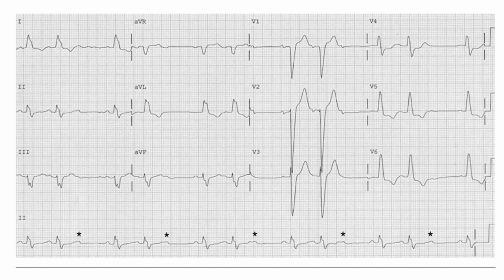If you see here, look at the rhythm strip. This is a P wave here, and this is a P wave here, but there is non-conduction of the impulse. And you can see the PR interval. This is the PR interval. They are all the same. So this is a case of Mobitz type 2 block, and you can always appreciate that here the QRS complex is wide.